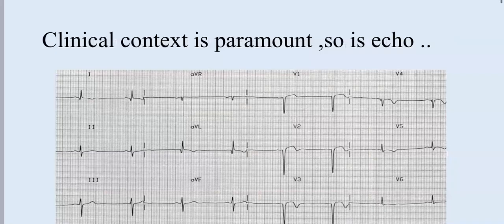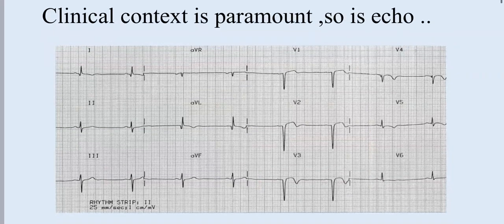Now, what is this? I come across this ECG, and I look at it just this way. So what's your diagnosis? If you don't have anything about the patient, you don't have any idea about the patient. Late presentation? Yes. Why did you say late? Because of the QS from V1 to V4. Exactly. With T-wave inversion and subtle ST segment elevation in the same leads.